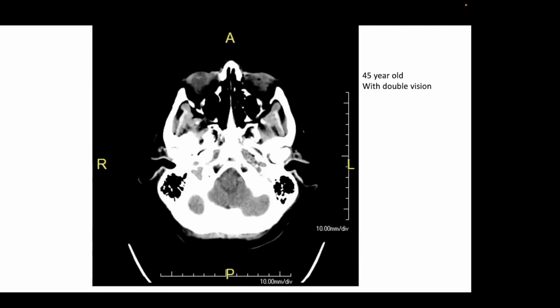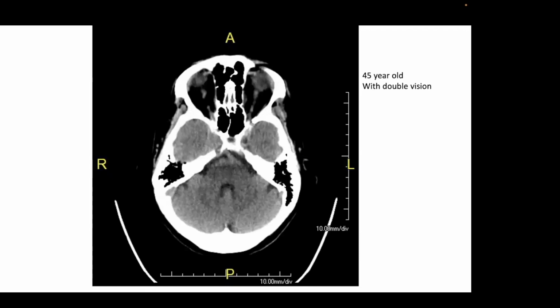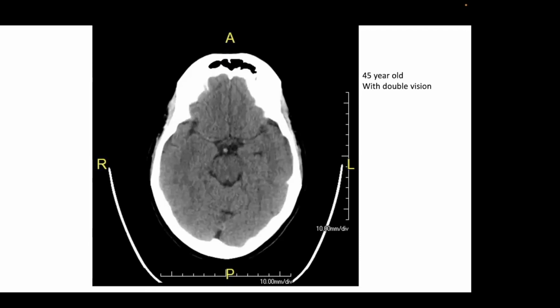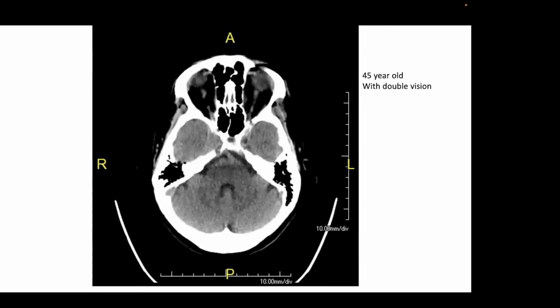I'll just go up through the orbits and all again. Anything? Oh, not yet. No, I don't see any. Okay, so this is the reason, right? And this was read as normal. The clinician who read the scan didn't have the complete history, and this was read as normal.